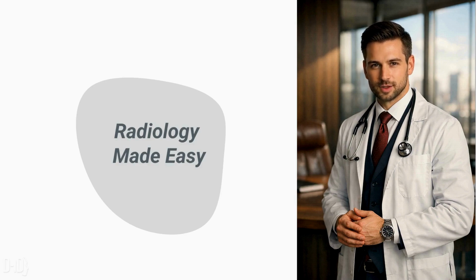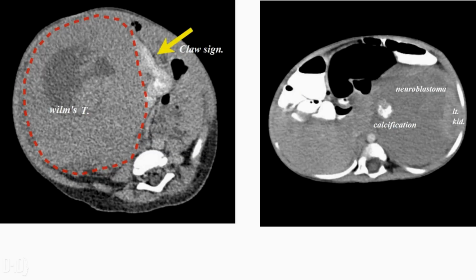Is it a neuroblastoma, or is it a Wilms tumor? Today, we are going to make that choice simple. The first question you must ask is, where did this start? Wilms tumor is a renal tumor. It arises from the kidney parenchyma.